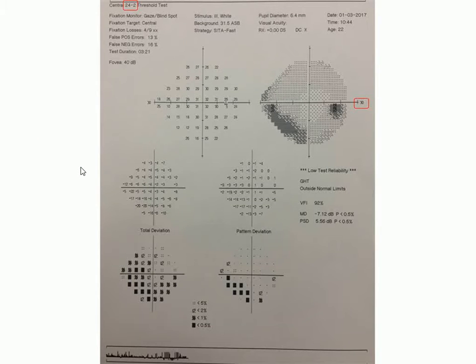Even that was found to still be very difficult for a lot of patients, and an effort was made to see if it could be made more efficient. And that led to a conclusion that for most people you could even reduce it further by 6 degrees and just test 24 degrees each way. The only area that was felt couldn't be sacrificed and still needed to be 30 degrees was the nasal area. So here, this is a patient's right eye test. This is where they're looking, and here we have 10, 20, and we don't reach 30 degrees. It's about 24 degrees, as the test says.